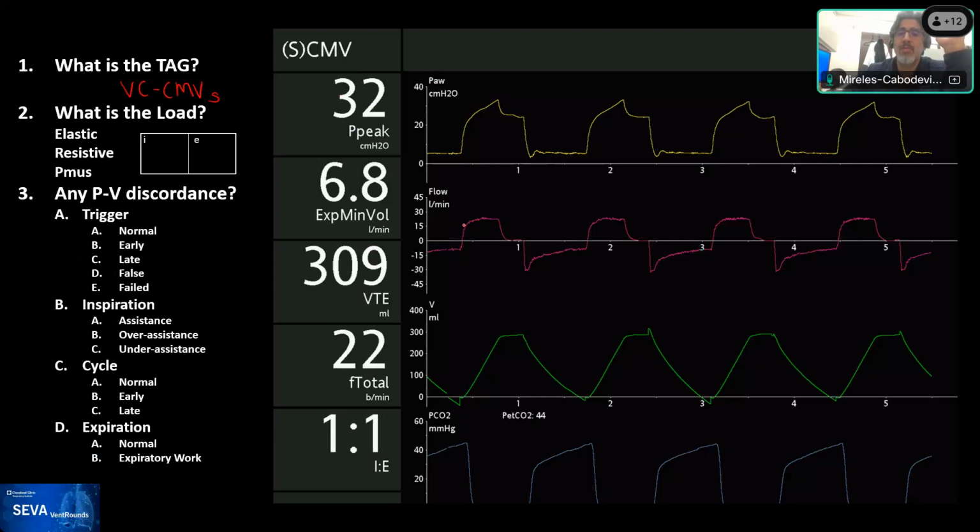And the reason is because the flow waveform depicted here is what's being captured at the Y of the ventilator circuit. So it will demonstrate some aberrancies that will not look identical to a very nice, and I'm going to paint over this one, square waveform.